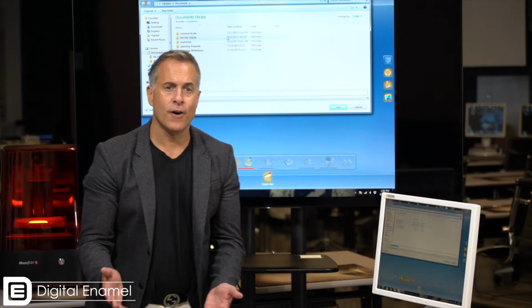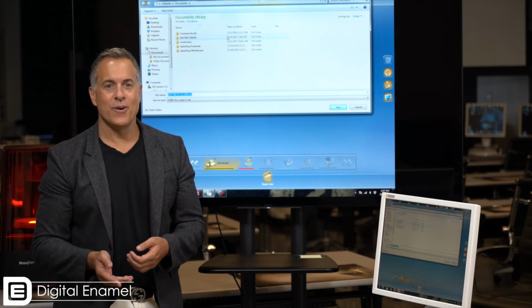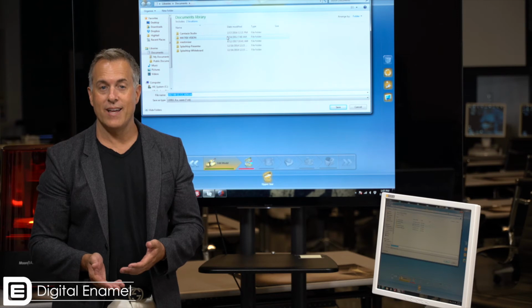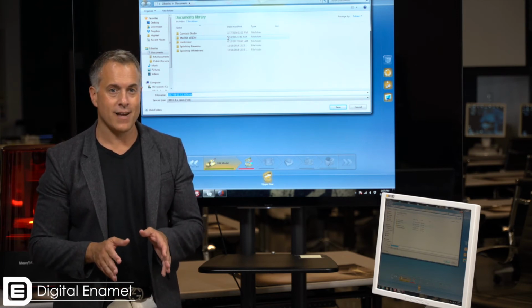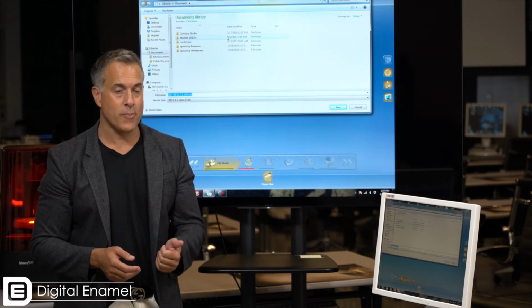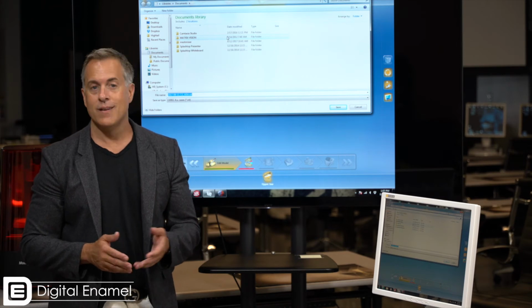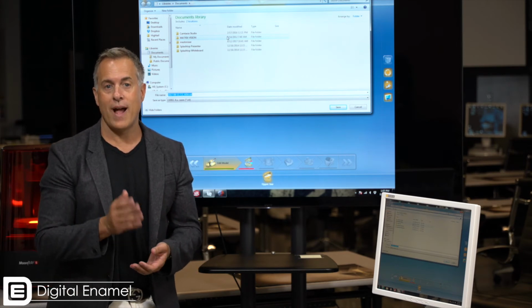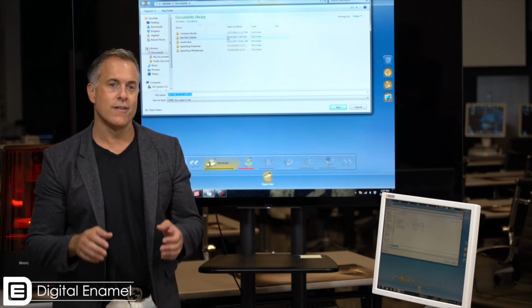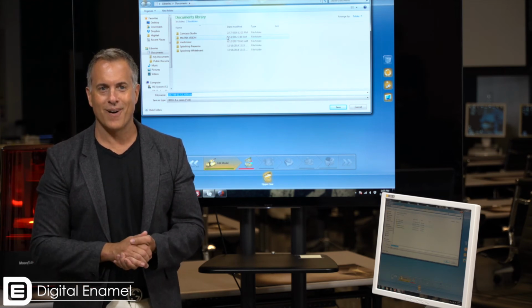So as a default, we usually export to the file format RST. As a Galileos owner, you may be used to exporting in the file type .ssi. So we're going to now export to the file type STL. Now, you can export to STL to 3D print, but if you're using a different type of implant software, such as Simplant, you can also export that STL file to another implant software, and are not limited to the Galileos software, although we all know the Galileos software is awesome.